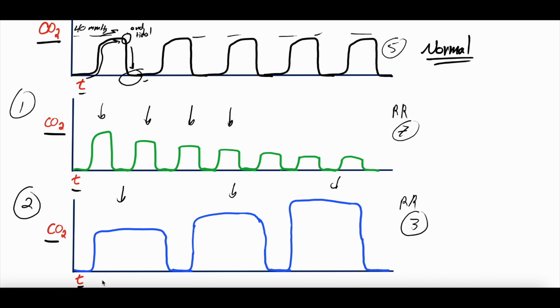The duration of the breath, this is time, right? This is duration of breath, is different too, right? This duration of breath is shorter. Let's just make up a time thing. We'll say this is 5, this one's shorter, this is 3, this one's longer, this one's 8.